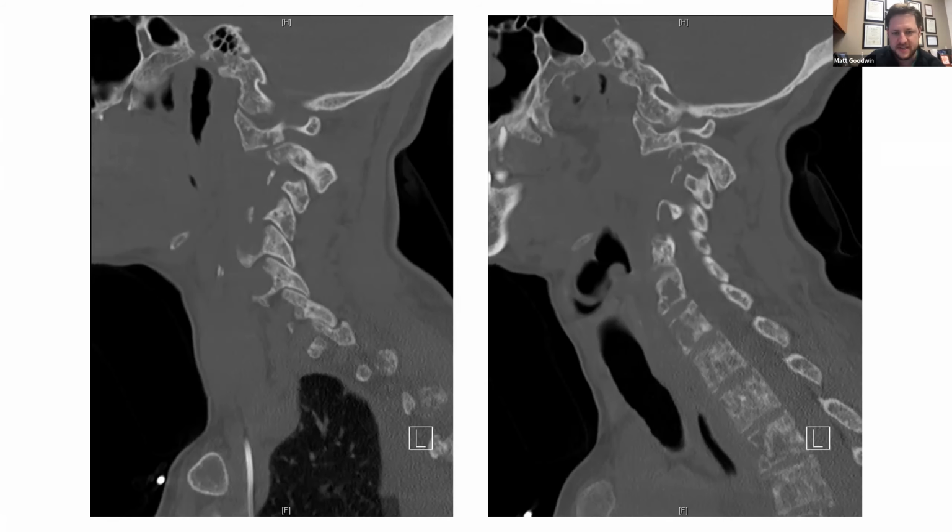Looking just through these cuts too, you can see it's not going to be awesome. Yeah, figuring out where to stop and then getting iliac crests, things like that.